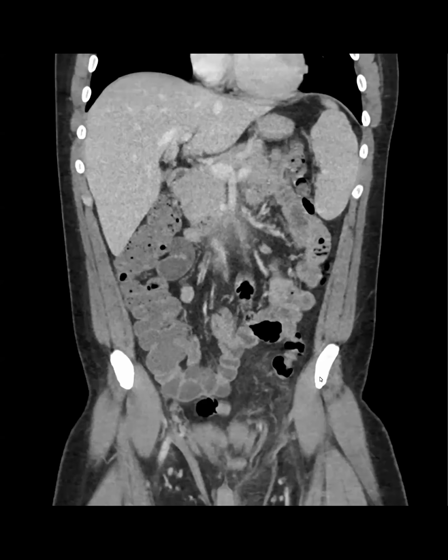Does this not look like the mucosa is still intact? Yeah, okay. But I think it's between the serosa and the middle. My friends at UT Southwestern were just telling me, and I didn't think about the point you're making, that it's bringing it into the radiation field, but they said this is inert gel and it doesn't damage the wall and it's fine.